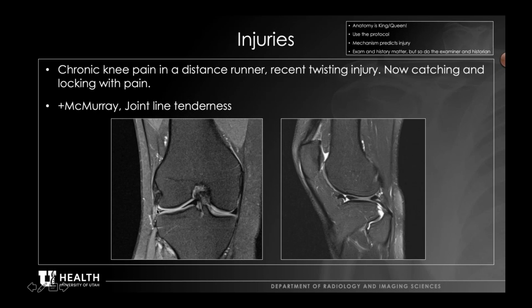On the lateral aspect of the knee, we see this gray schmutz, but I don't really see a triangle. And so where is that triangle? Well, it's actually been displaced. So it's actually torn in this case, and this is called a bucket handle tear. And the meniscus that's supposed to be out here on the lateral aspect of the joint has actually flipped into the joint space. You can see why that would cause some major mechanical problems in this patient.